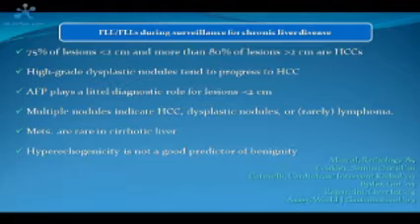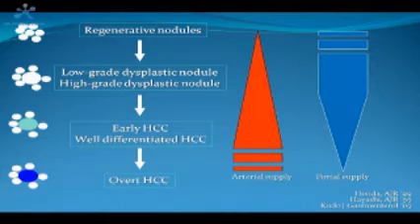And the baseline ultrasound appearance is not enough to have a final diagnosis, because also hemangioma-like lesions can turn out to be hepatocellular carcinomas if we use other imaging modalities.